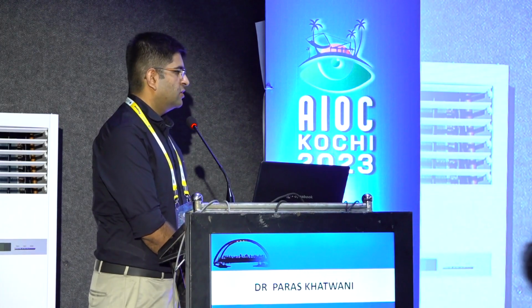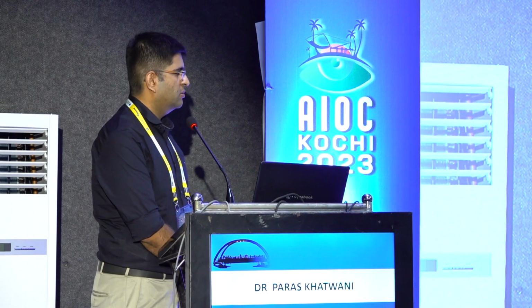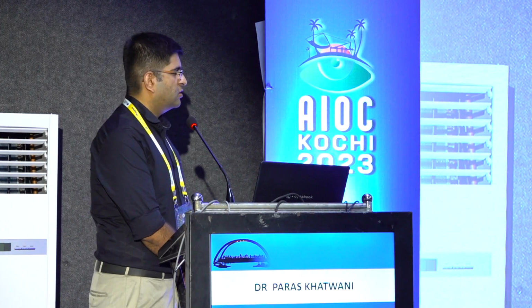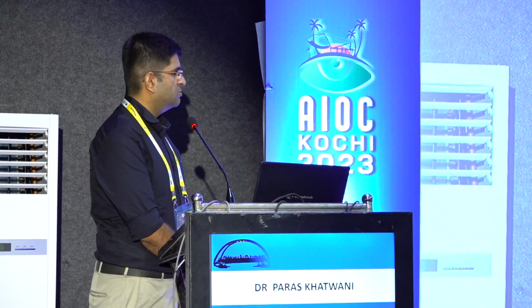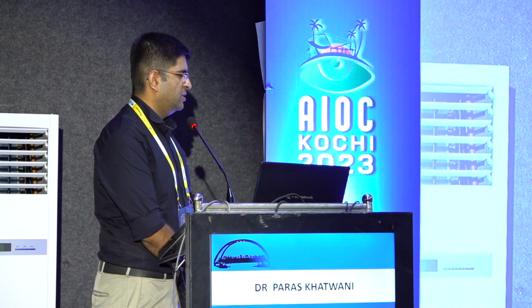What other diseases is the MCI beneficial in? Just asking. They are more beneficial for AMDs, to determine the geographic atrophies and the involvement areas. So that is one of the places where MCI is gaining importance. Apart from that, ma'am, any melanin tumor is very well recorded on infrared reflectance of MCI. Previously, IRAF was used for melanoid tumors, but the resolution that the IRAF provides is very less compared to the IR reflectance image obtained on the MCI.